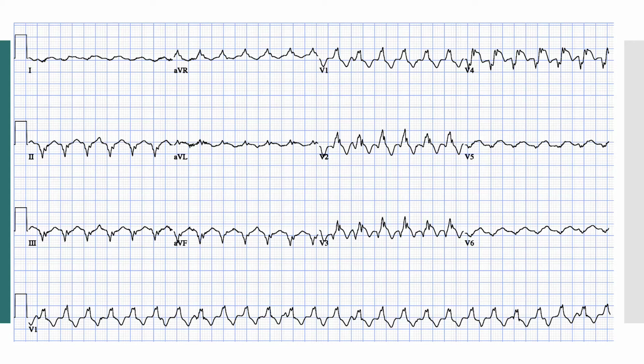If you look very closely, you can see the P waves on this tracing, and you're welcome to pause the video to find them yourself, but I will mark them here. As you can see, you can map the P waves, map the sinus rhythm all the way through the tracing. So there's more V's than A's, there's AV dissociation, so this has to be VT. So this is an example of a VT that cannot retroconduct to the A. And then there's an ambient sinus rhythm in the atria, which is the definition of AV dissociation.